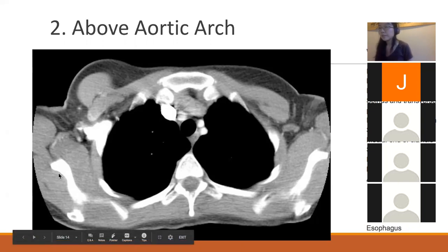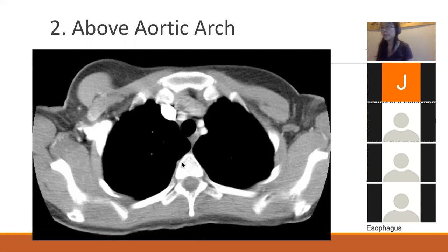Okay, so with that aside, we now have identified most of the bones. Once again, we have the vertebral body here. One other thing to note is that as we get further down into the thorax, the bodies of the vertebrae are going to get larger and larger. If you go back to the previous slide, this body is going to be a little bit smaller, which is another tip that it's more in the cervical-ish region. And then we have two more ribs coming off. These are all pieces of your ribs.